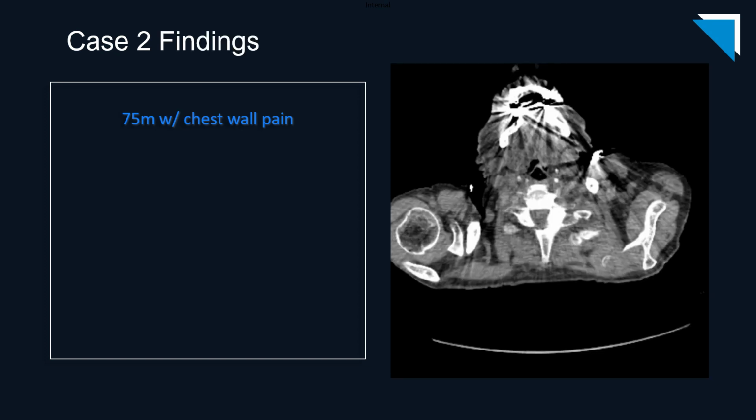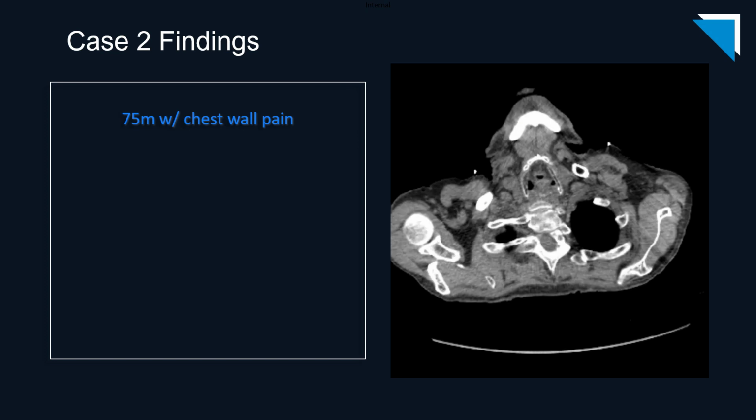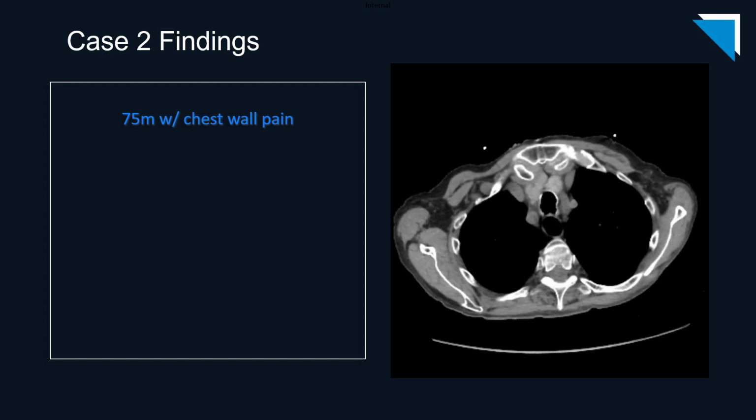Let's begin by scrolling through these axial images from a non-contrast CT scan of the chest.